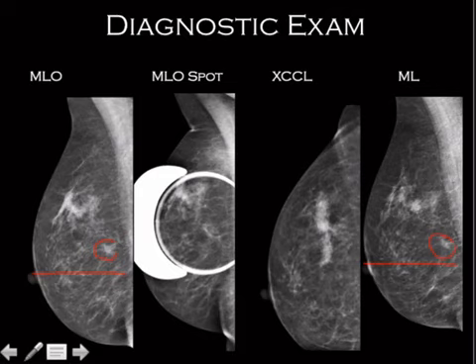So I'm expecting that it's going to be in the lateral breast, even though I'm not 100% sure that I'm seeing it on this CC view. I would probably describe this thing as high density, either high density or equal density. Remember that we're not comparing it to the fat, we're comparing it to this breast tissue here. So it's either high density or equal density. It looks like it's probably round, and that the margins are either obscured or spiculated.